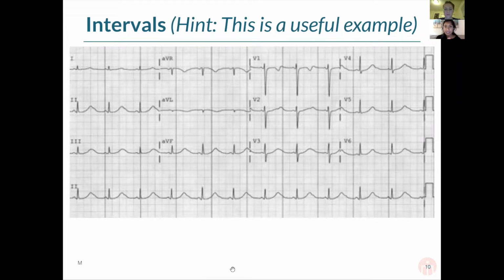So the first thing that's important is determining a lot of the heart blocks. And this is where this becomes clinically relevant, right? The PR interval is going to be crucial in the heart blocks. So the normal PR interval is between 120 to 200 milliseconds. The upper cutoff that you just need to know is 200 milliseconds. So really just look at the boxes and see, do we go over that? If not, that's a normal PR. So PR 200 milliseconds is your cutoff.